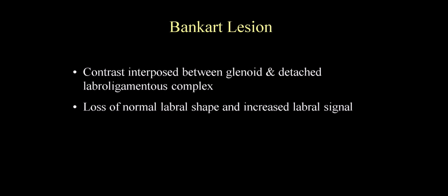Okay, so when we call a Bankart lesion, by definition, it's only soft tissue. So it's the labrum, it's the ligament. We're not talking about the bone. If you see an actual fracture, that's an osseous Bankart lesion.